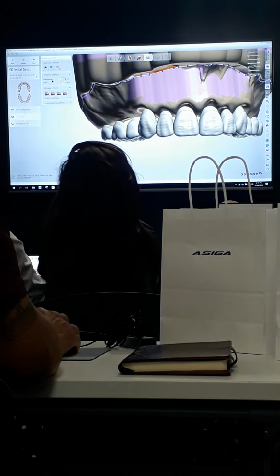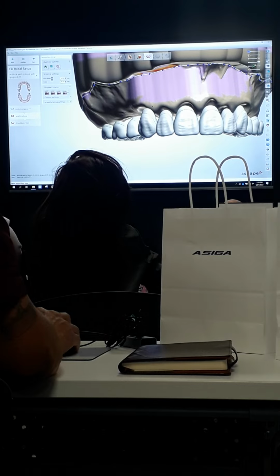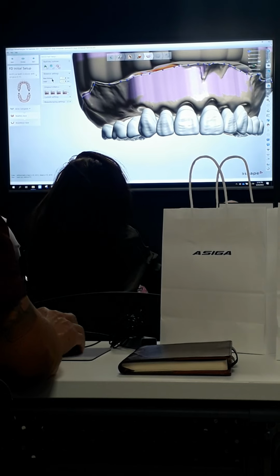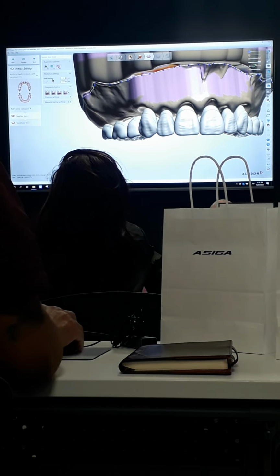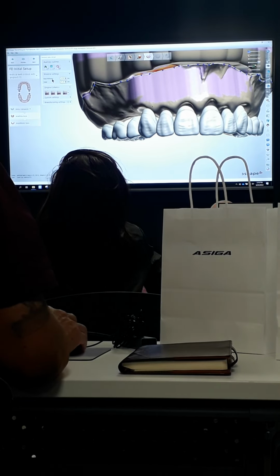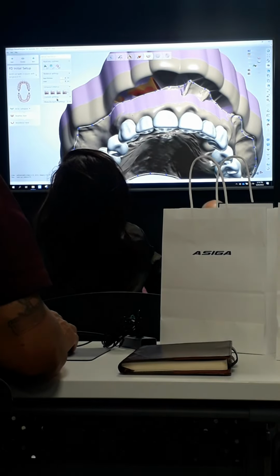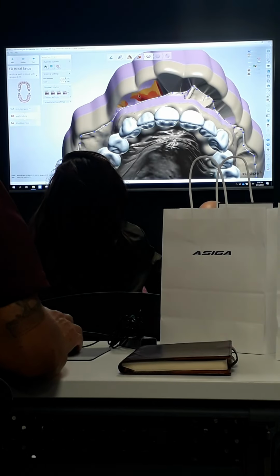The other advantage to doing the automatic blockout is, let's say you didn't block this out, but you have this massive anterior undercut. You produce the denture. What are you going to do? You're going to take a handpiece and go inside of it. Well, that's going to thin out your base quite a bit. What this will do is push the beginning of the base out to the outside of the blockout wax, and then it'll give you that minimum thickness outside of that, so you don't have to worry about the denture base being too thin. So when I generate it, it'll generate with the thickness outside of this pink wax, not inside of it.